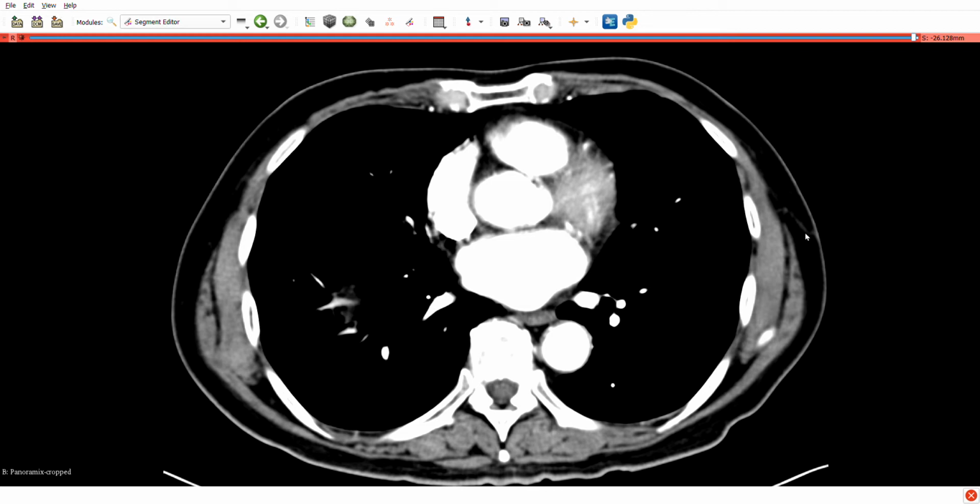In this video, I just want to take you through some of the major abdominal blood vessels visible on a CT angiogram of the abdomen. And as we make our way down through the abdomen, we'll identify some of the other major structures as well, but we are going to primarily focus on the vessels.